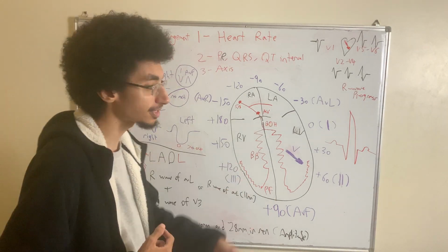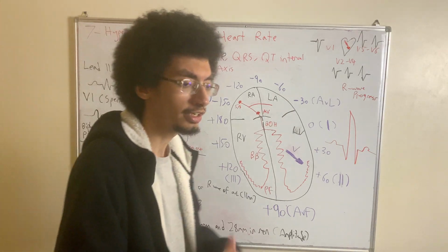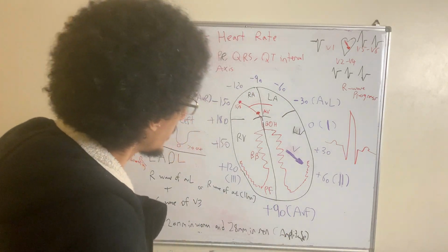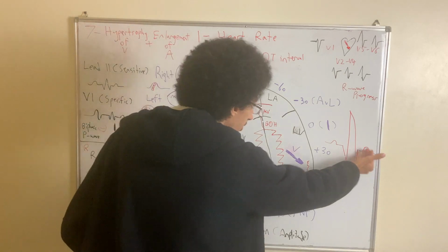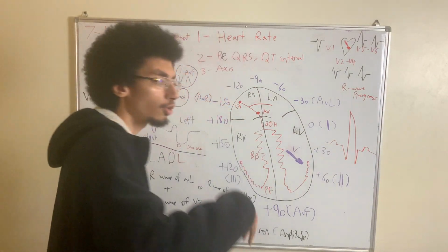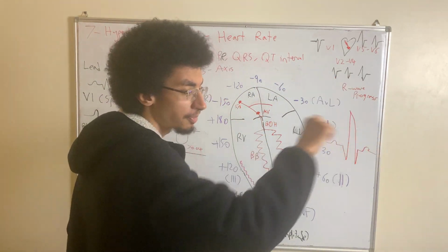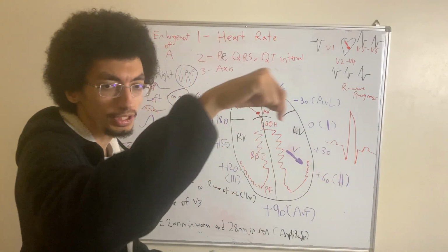And the problem with cases such as aortic stenosis is that eventually this can progress to left-sided heart failure, right? And eventually, you might see a change here with prolonged left ventricular hypertrophy, seen in almost all cases. And that is, the ST segment will be depressed. The T wave will be inverted.